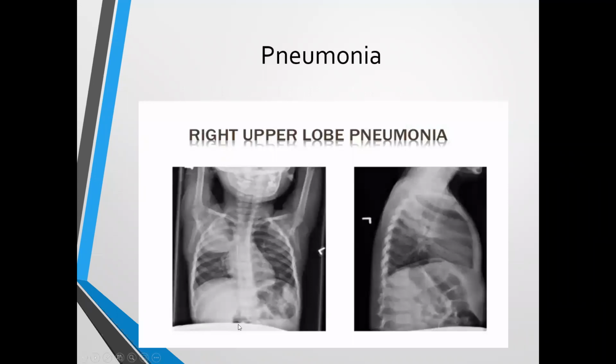Pneumonia, and you're really looking at upper right lobe pneumonia here. This is obviously a very young pediatric patient. You're seeing both an AP, or anterior posterior, and a lateral. It's really more in the upper posterior, which is where you can often find it if a kid aspirates. It also has to do with the bronchus feeding that particular lobe of the lung; its positioning is more apt to be problematic if the kid aspirates.